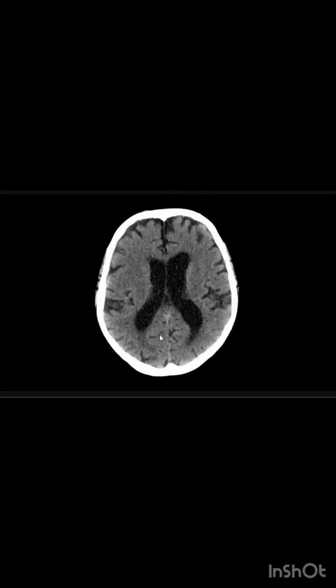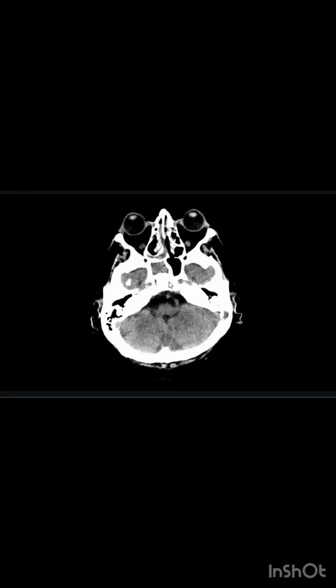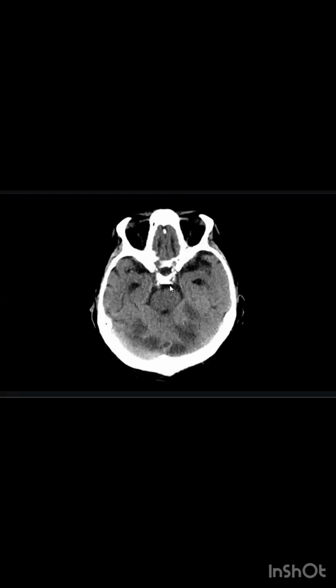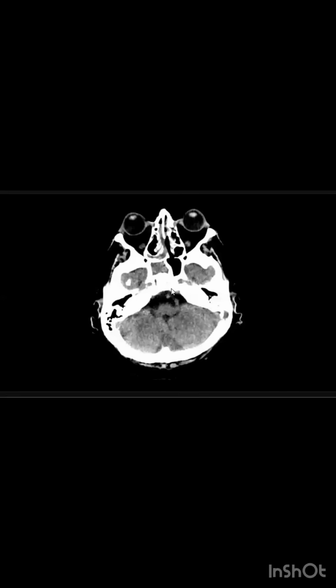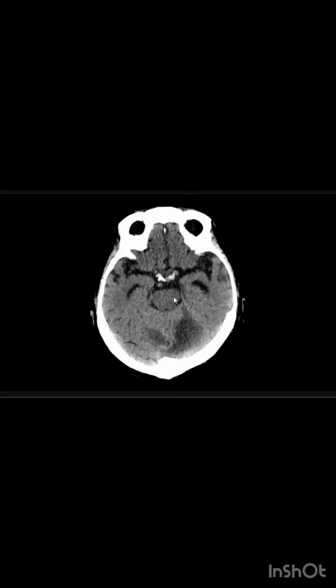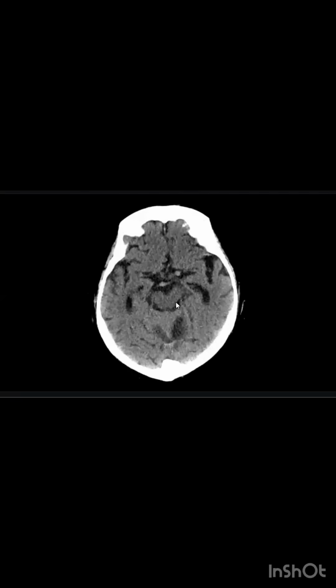I will like to see the base of skull also to look for any fractures. I can see opacification of the left maxillary and ethmoid and right sphenoid sinuses, which could represent hemosinus in the setting of trauma. I will like to see the bone window to look for any bony fractures. There was no trauma, just a fall. So, the cerebellar hypodensities could represent infarct. I will like to proceed with the MRI for confirmation and CT angio.